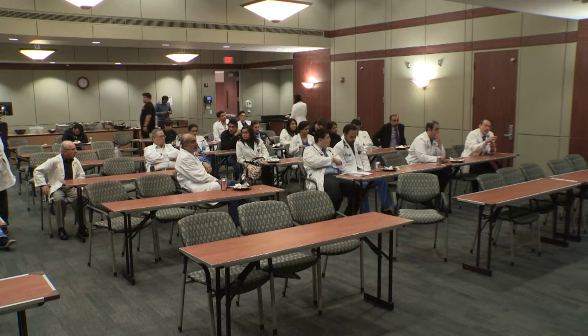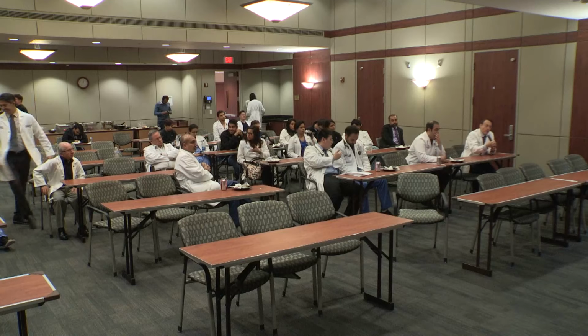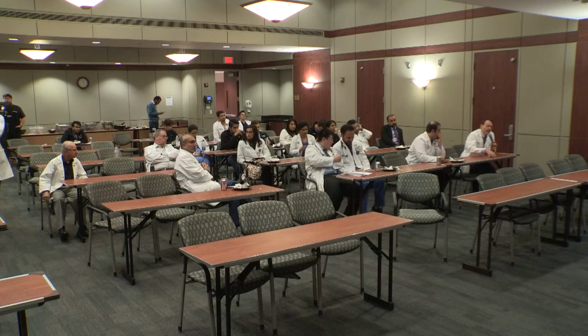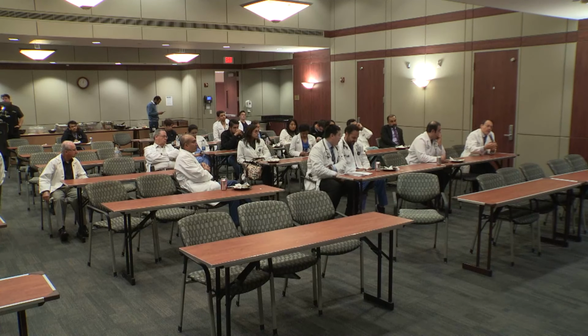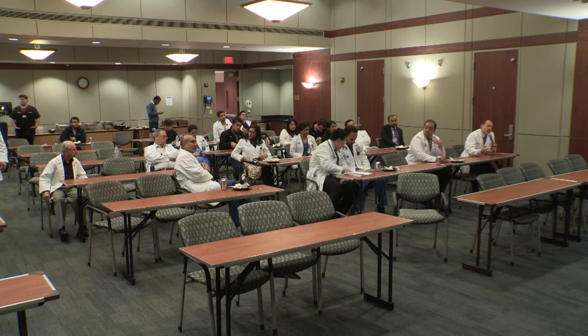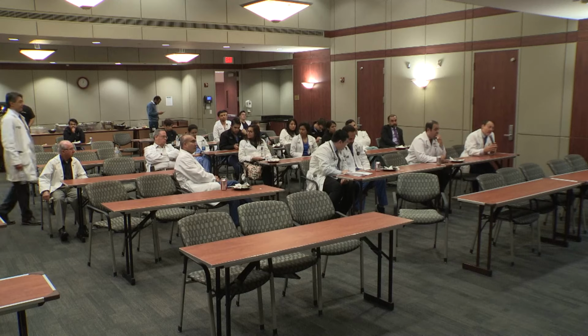So you said you do it routinely, or you do it in situations when you are not seeing the expected responses to what you're changing the speed? We're doing it routinely as well as for any changes that happen. Were there situations where clinically things were fine, whatever you got by echo was within your expectations, and then when you did the CT, unexpected findings occurred that altered management?